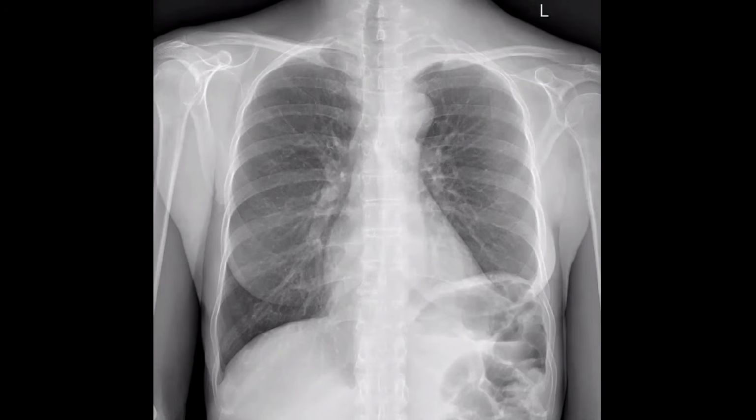I think this is the unfolded aorta. No, that one beside it, adjacent to it. I think this is normal bronchovascular markings, and the left diaphragmatic copula is well defined. If we had something in the lower lung lobe, it would silhouette the left diaphragmatic copula. So we don't have anything in the left basal lobe.